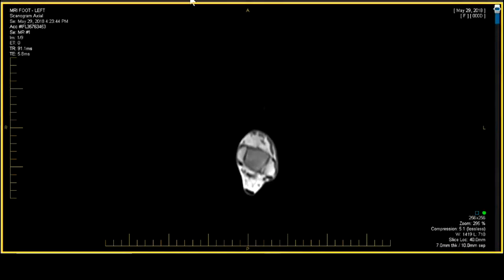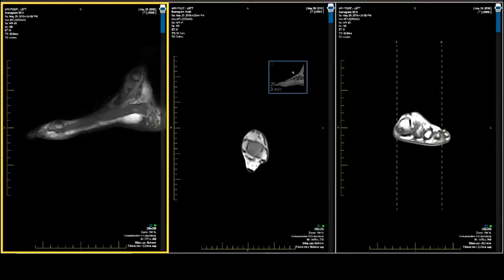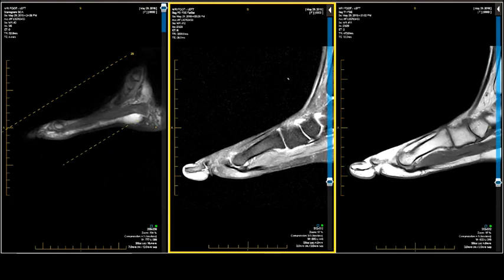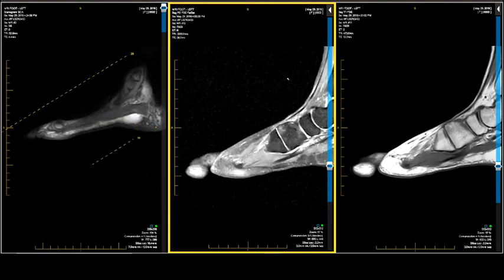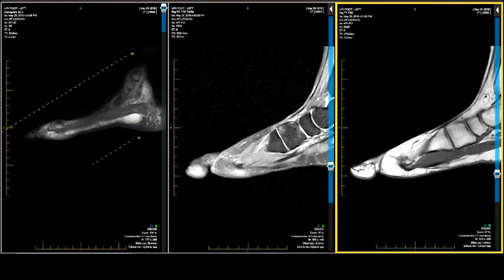50-year-old female with dorsal forefoot pain after an injury. Let's see if we have anything water-weighted, just to get a pattern of injury. This is more of a forefoot study, but most of the swelling seems to be over here, doesn't it?